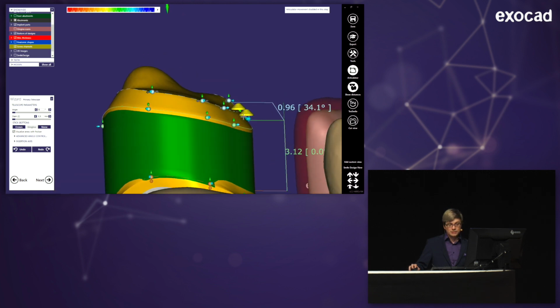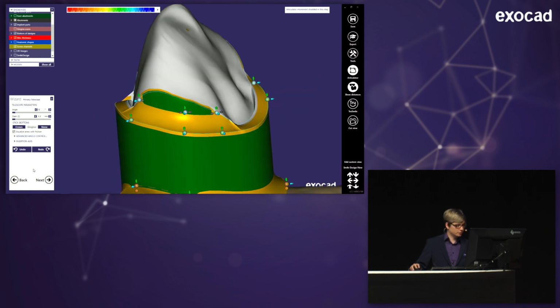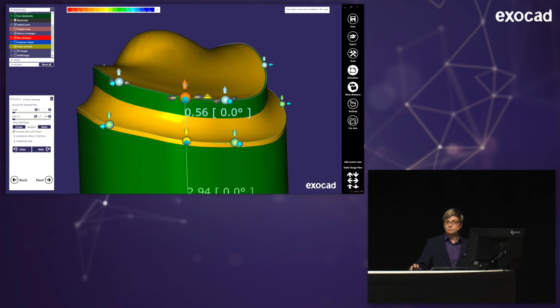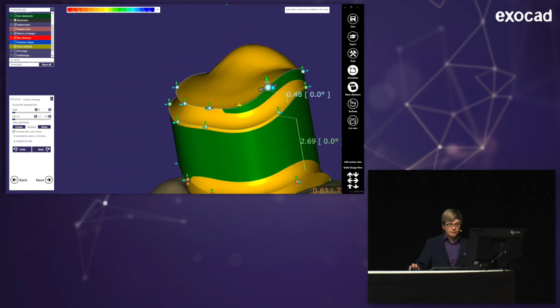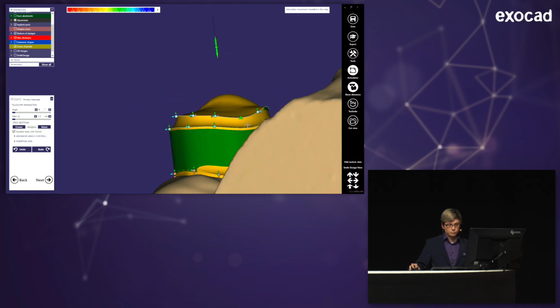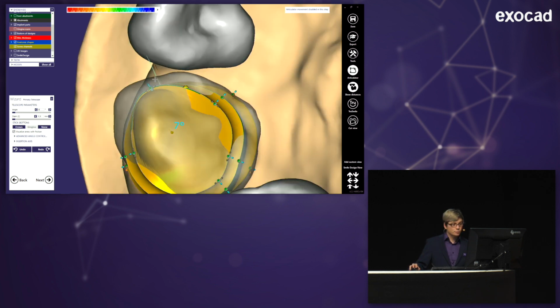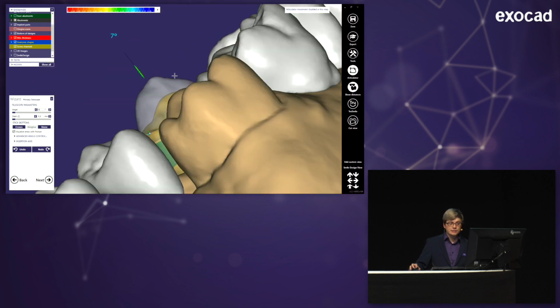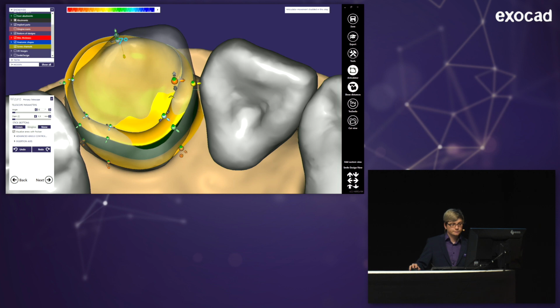For now here, normally it's the yellow one. I'm changing it to green, so I get a bit of a shoulder because it tries to design a parallel surface here. And I'm also hitting other buttons. If I pull this up, you see the parallel surface. But for a shoulder, this is enough. And now I'm trying to get this really plain. Now, using my anatomy here, I can orient where the points at the end have to be placed. You will see what I mean with that right away, because I'm pulling them out a bit. Because here, the rotation lock will be placed in the end. For that, I need a bit of space here. You can always activate more points if you need those for more control.